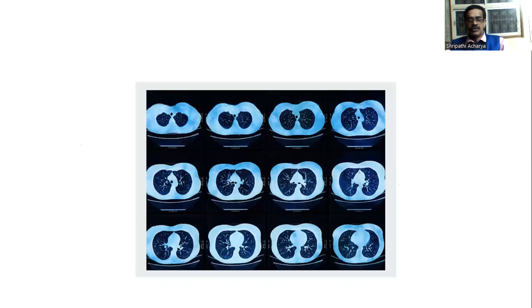So this is a film of CT scan of the chest. You can see at different levels the body structures are studied as slices. So near the neck or below the neck and below. So we can see lung and heart and also mediastinal structures.